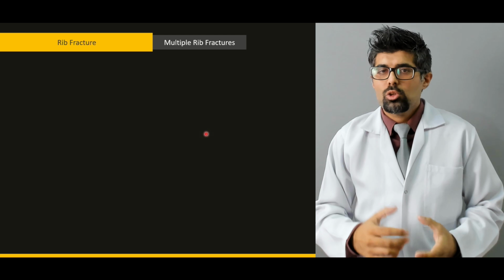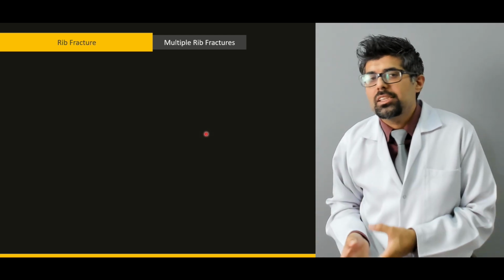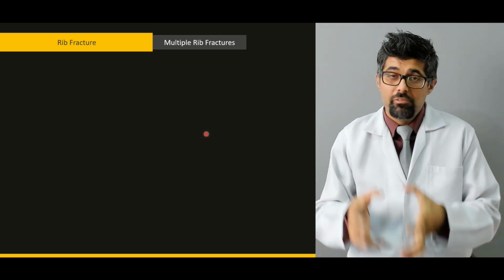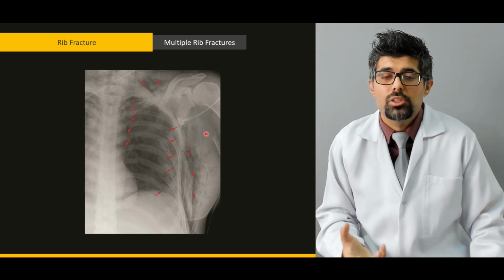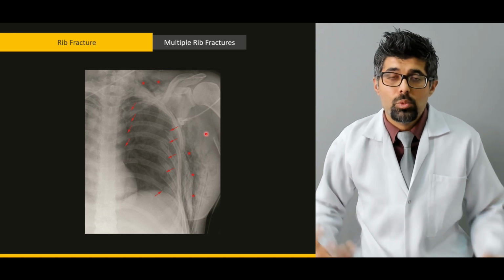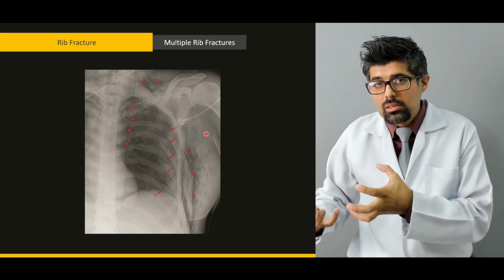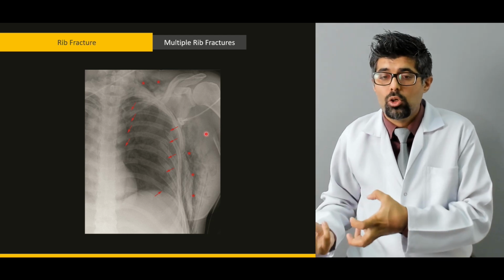Sometimes there's not just one rib that fractures. In complicated accidents, multiple rib fractures happen, and these multiple rib fractures puncture viscera at multiple points. For these kinds of fractures, the primary thing that happens is a pneumothorax, because when the rib fractures the lung, air escapes into the chest cavity, and that escaped air into the chest cavity produces the pneumothorax.